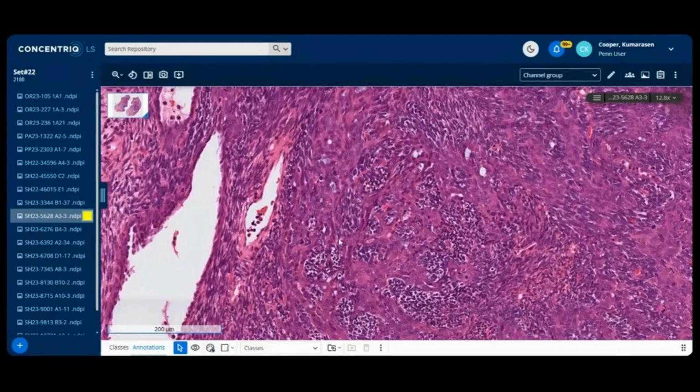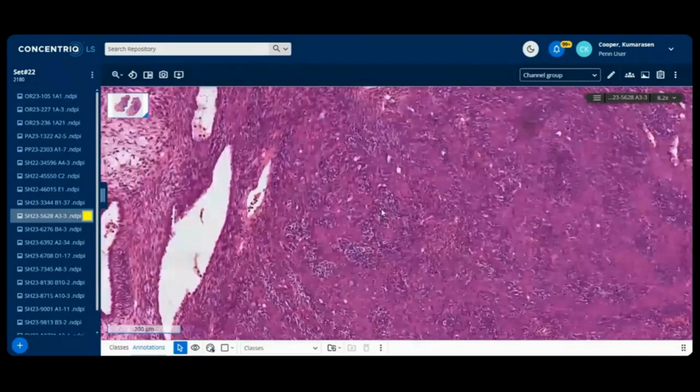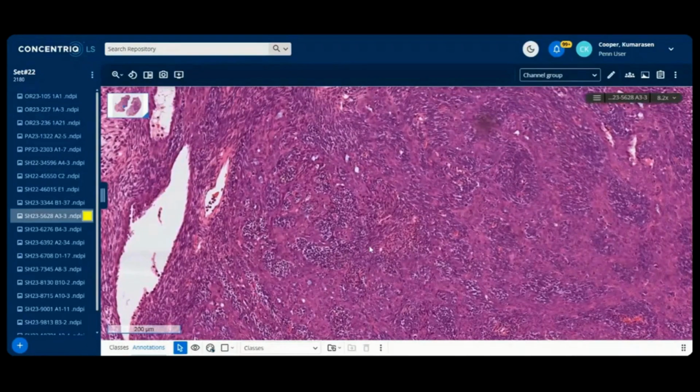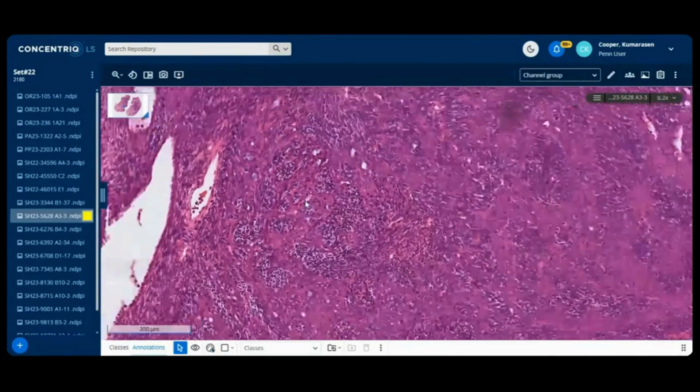Okay, so let's go back to the slide. And again, forgive us because I've got to go through the two different screens in order to read your comments. And this is the slide comment. So let's give you the cytokeratin. And the cytokeratin is much stronger in these glandular-like areas and these epithelioid areas. The EMA is also focally positive. The CD34, I recall there was a CD34 there. Yes, that's negative. The S100, I should warn, can be patchily positive.